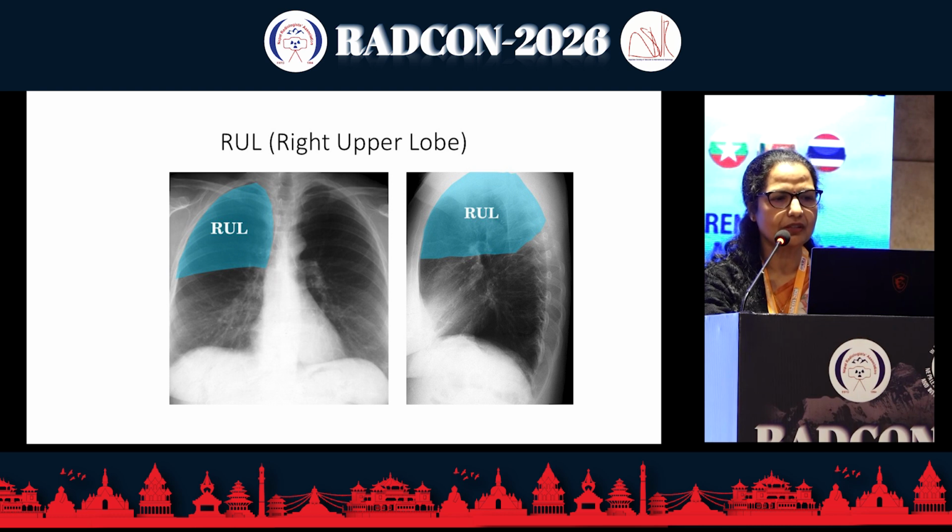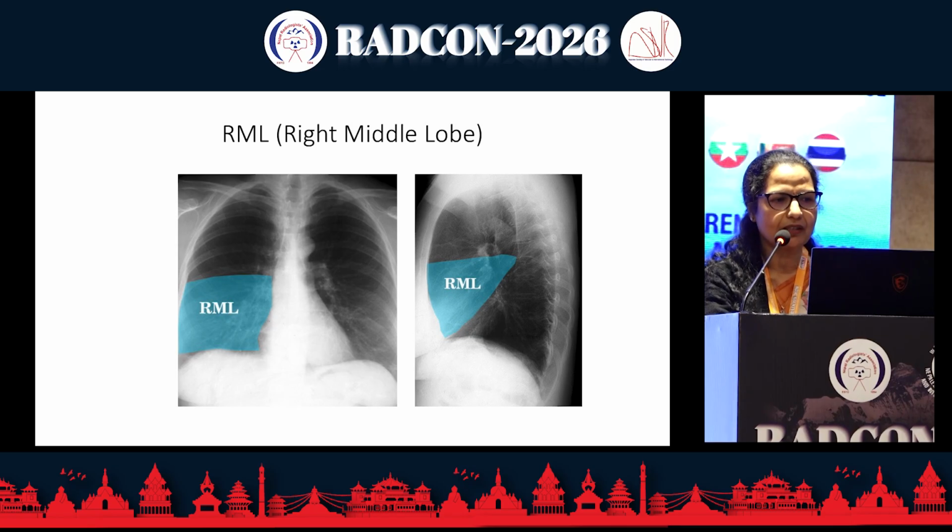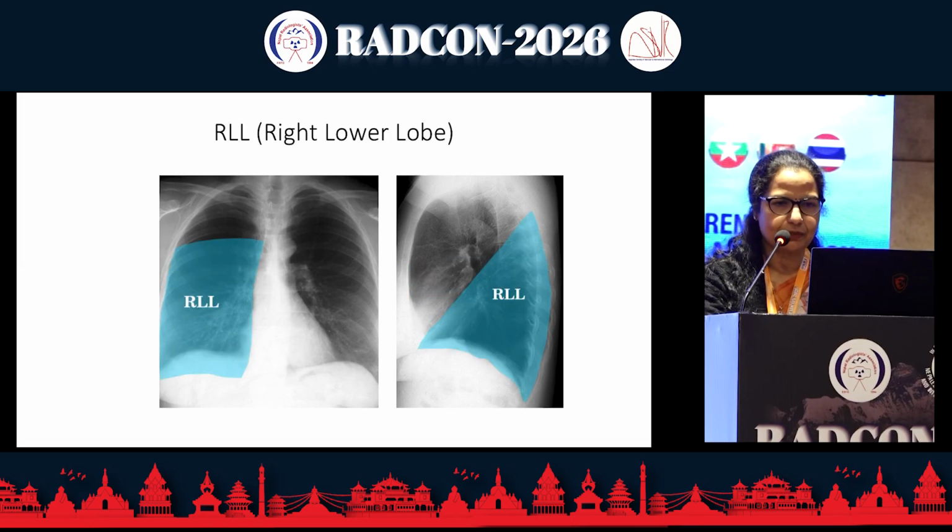This horizontal fissure is on the anterior inferior, and the oblique fissure on the posterior superior part. Similarly, the right middle lobe is the lower half of the right hemithorax, and the lateral view exactly depicts the location. We need 2 radiographs for exact location of the pathology: horizontal fissure on the superior and oblique fissure on the posterior inferior aspect. Similarly, the right lower lobe is almost 2/3 of the right hemithorax, but the lateral view comes to our rescue, with position posterior to the oblique fissure.